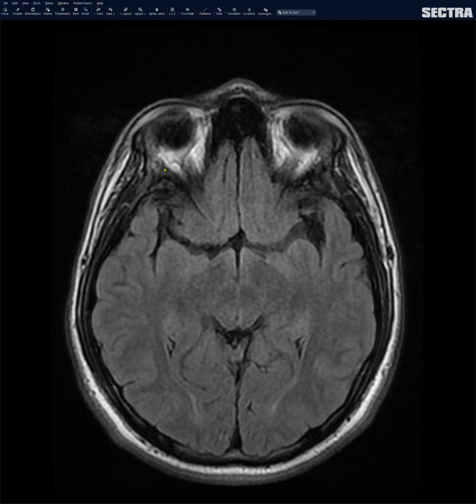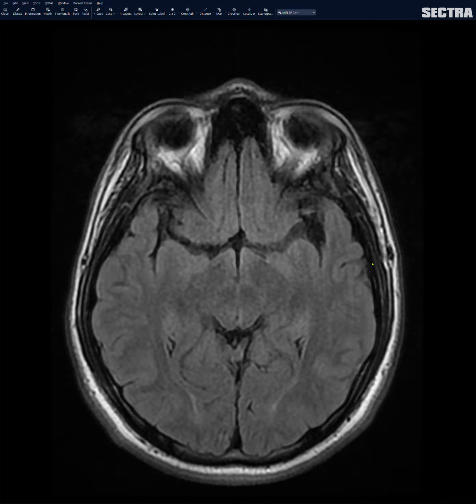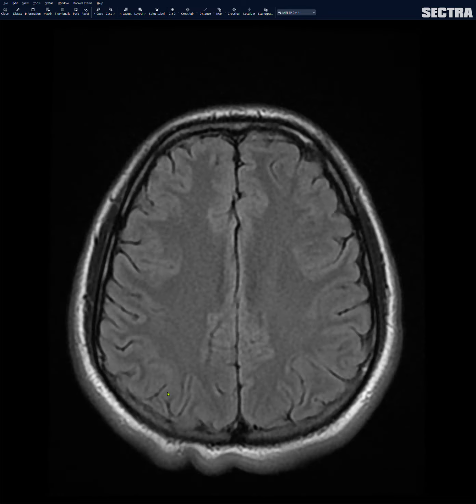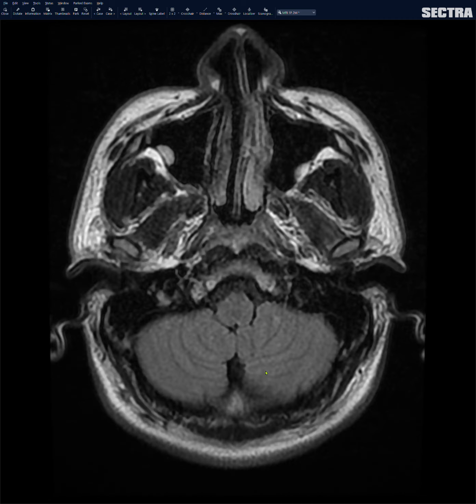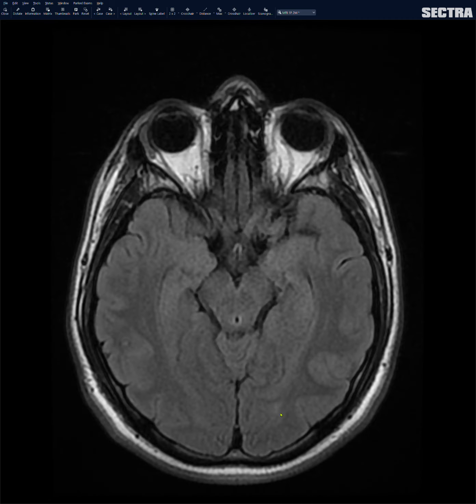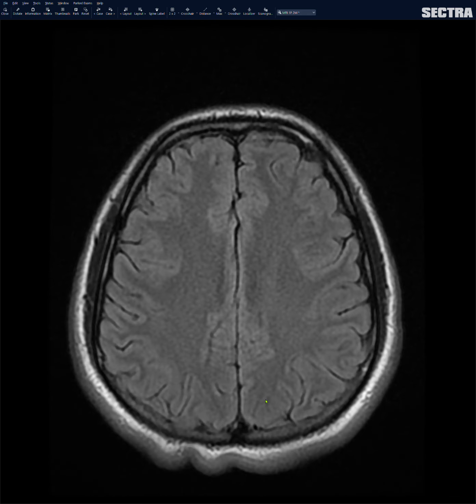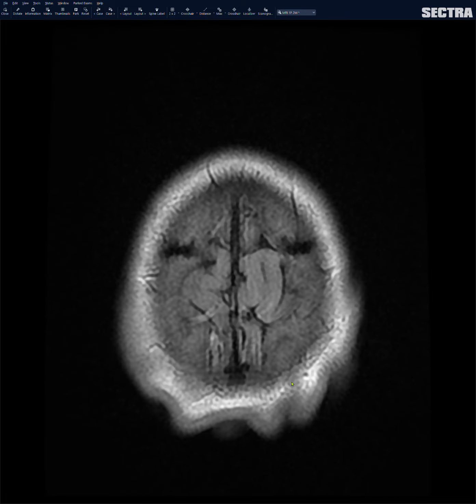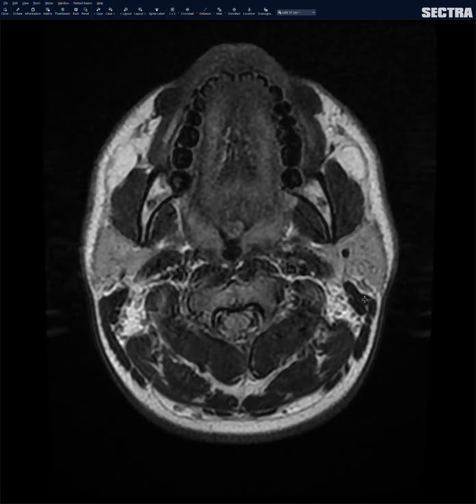So I look at the frontal lobe on the right, frontal lobe on the left. I look at the left temporal lobe region, right temporal lobe region, right parietal occipital lobe region, right cerebral hemisphere. Again, looking at the cortex, looking at the sulci, looking for any kind of hyperintensity in the sulci, looking for any kind of thin subdural hematoma, which can be subtle, and looking for any kind of cortical signal abnormality. All right, and that's the T2 FLAIR.